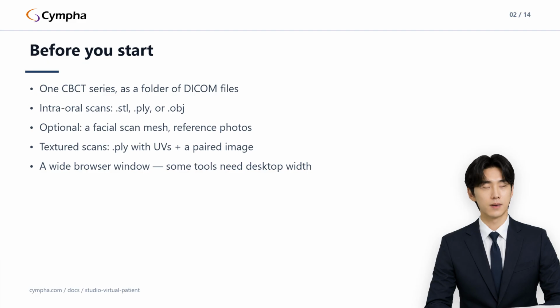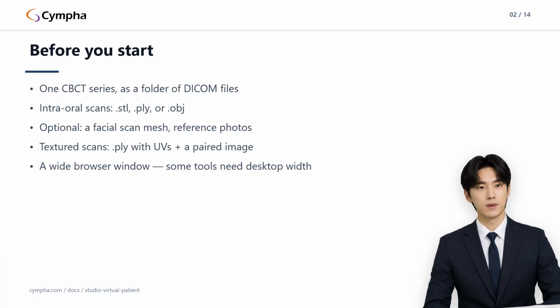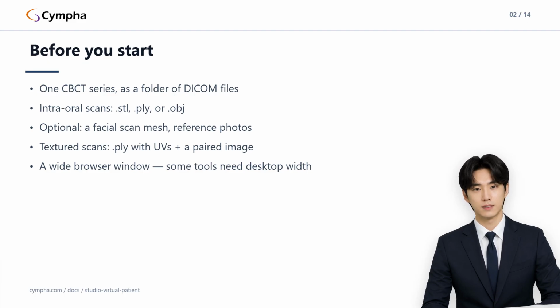Optionally, bring a facial scan in the same mesh formats, and any reference photos, extraoral shots, smile shots as ordinary image files. And use a wide browser window. Some Studio controls only appear at desktop widths, roughly 1024 pixels and up. Open studio.cympha.com. Nothing in this workflow needs an account or a sign-in.